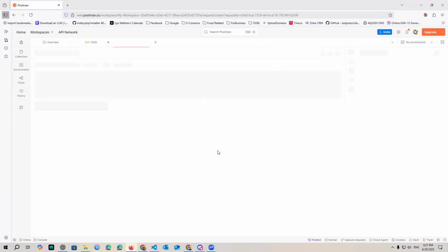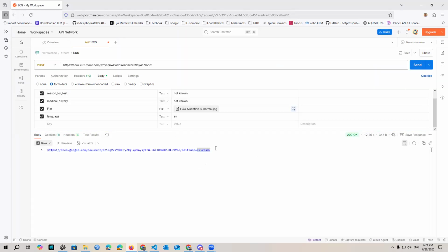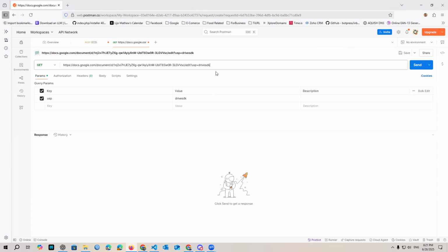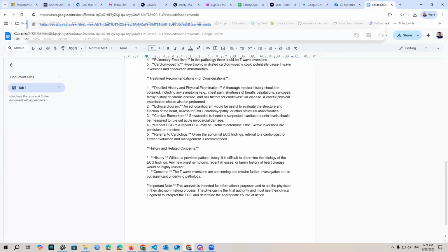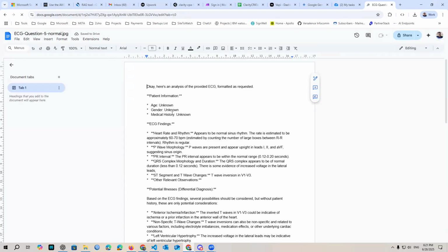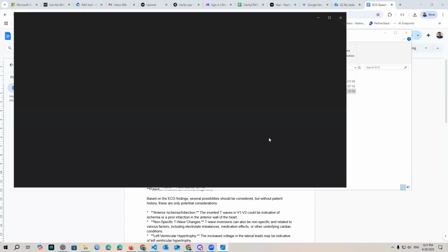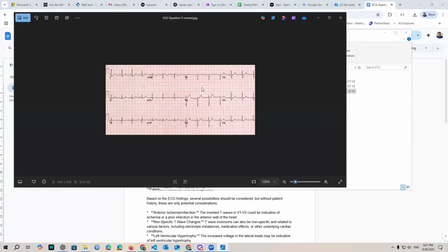Okay, we have the output. Let's copy it. Let's click in. And let's go to this ECG now. Okay, in this, the patient's details are unknown. So let's check what is the ECG. Yeah, there's no data.